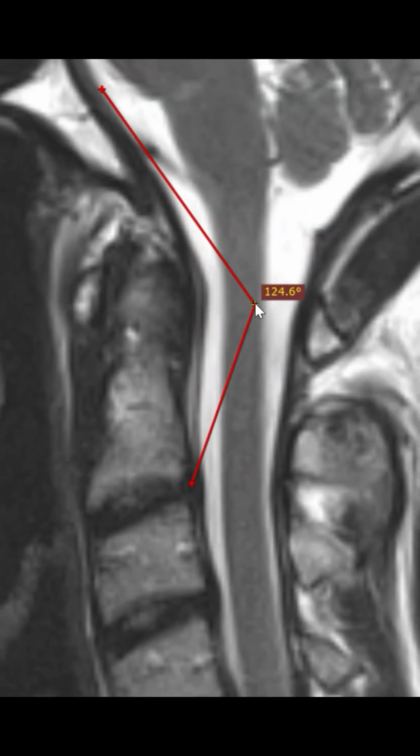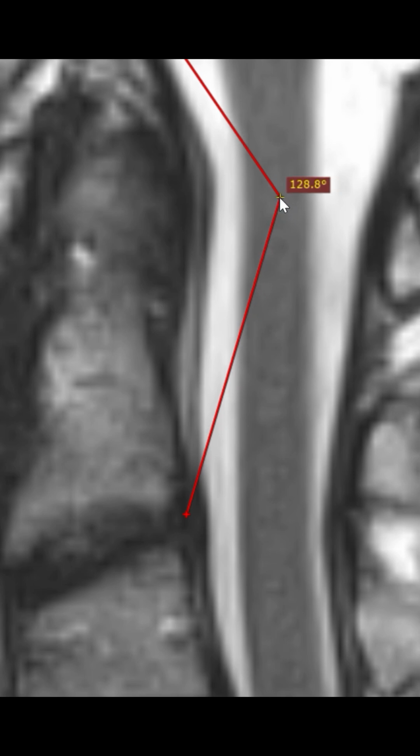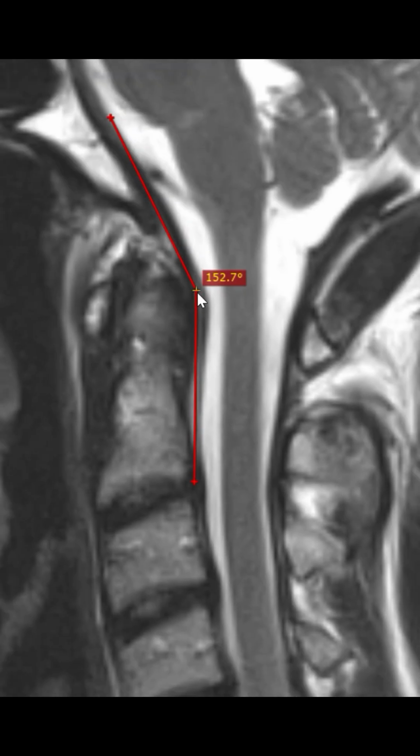Now the next part here, of course, we have the dens, and this can be a little bit tricky because you have some dural infolding and maybe there could be a pannus swelling of the tissue, but let's do our best and take the dura as being here. It's probably over here, but C2 is likely probably right there. And that would be the bone portion of this.